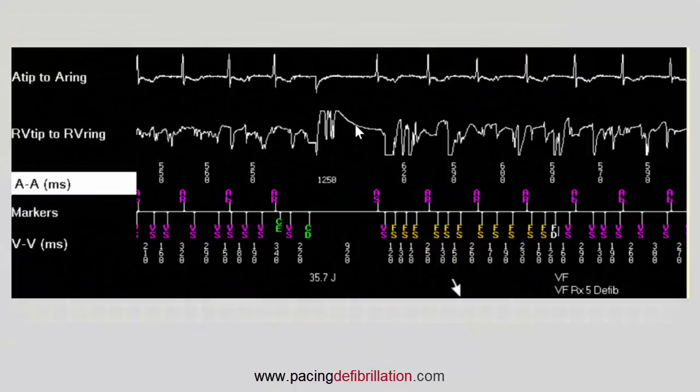This is a historical presentation of lead dysfunction, since in these patients we observed every dysfunction that was possible. We had an increase in the threshold, an increase in the impedance, an alteration of the quality of the sensing. We also observed very short cycles, multiple episodes of non-sustained tachycardia, and an episode with multiple shocks.